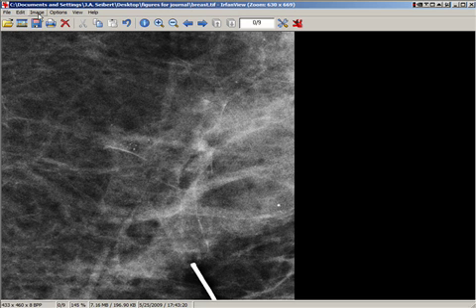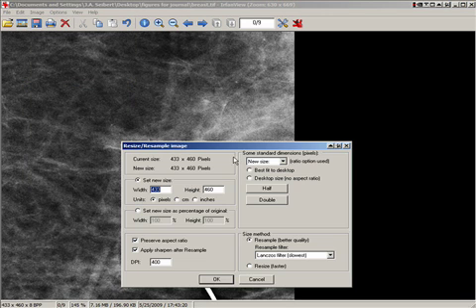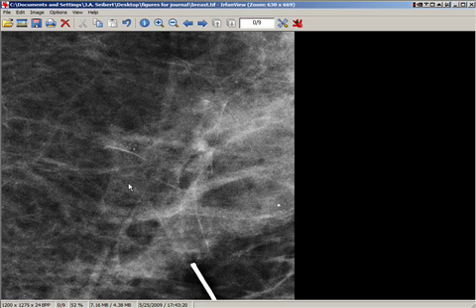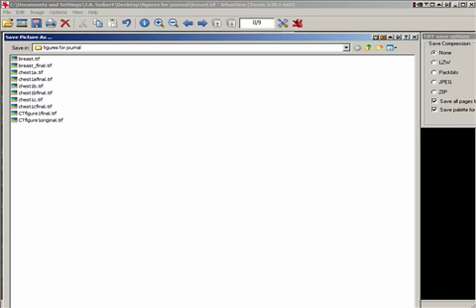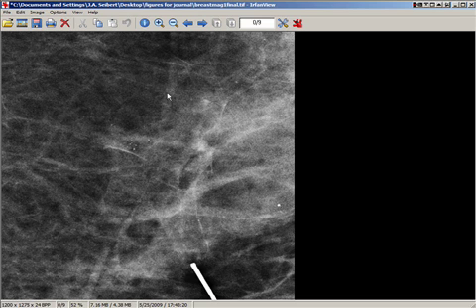And I can now image resize this example, and I'm still at 400 dpi. I want to have that be a 3-inch width as well. Now I have a 3-inch width, and I can do File, Save As, and I'll save this as breast mag 1 final, because I want to do this one more time just to make sure that I get the microcalcifications visualized. So we save that, and then we can do that cropping routine one more time.